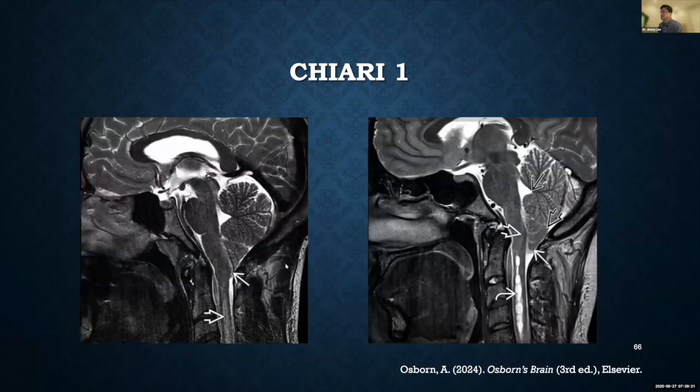Here's a typical, again, textbook kind of appearance of Chiari 1 malformation. There's a syrinx in the signal in the C-spine. Here are low-lying peg-shaped cerebellar tonsils. And here, again, a different patient with low-lying, peg-shaped tonsils, effacement of CSF space of foramen magnum with a syrinx.